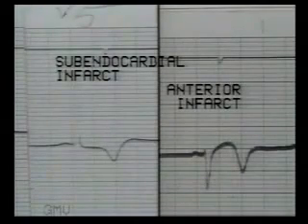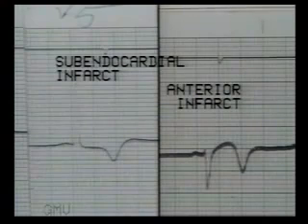At this stage, let us remember the picture of anteroseptal infarct where the ST segment is elevated and T wave is inverted. Compare here on the left ST depression in subendocardial infarct and on the right ST elevation in anteroseptal infarct, both with inverted T waves.